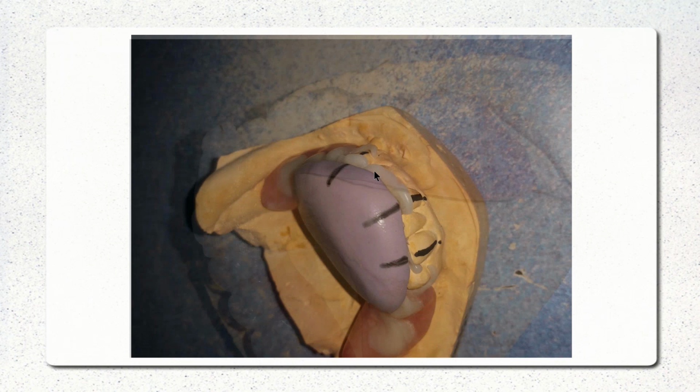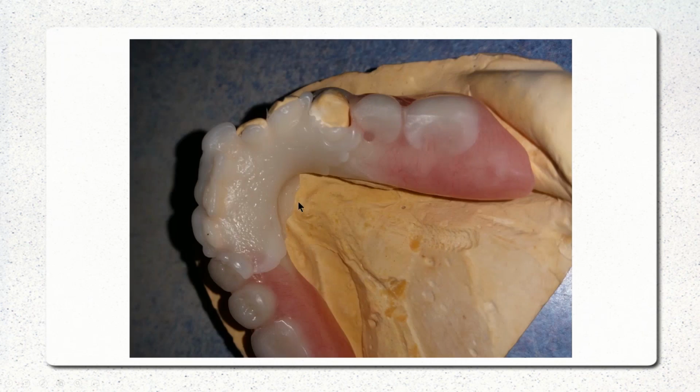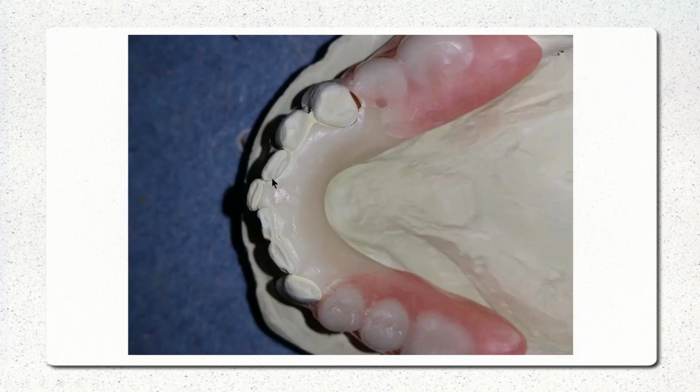Here it is with all your flash. There it is all trimmed up, perfectly adapted to the lingual of that case now. Ready for polishing and to go back. All right, so before and after.